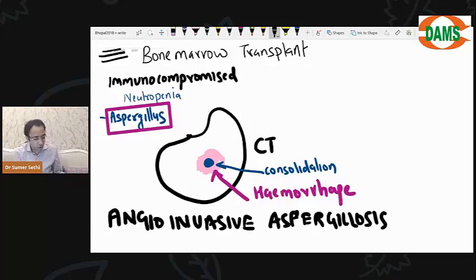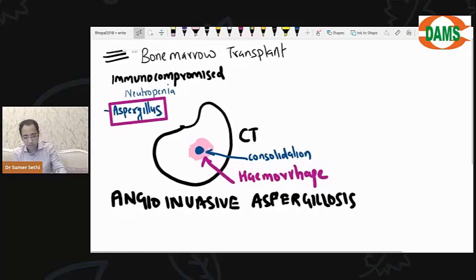Beta, वो cavity तो थी. Cavity हो सकता है. In the first image we saw a cavity that was probably because of old tubercular infection. है ना? But now what you have inside the cavity is a fungal ball. Everybody understands? Now let's see if you can answer.